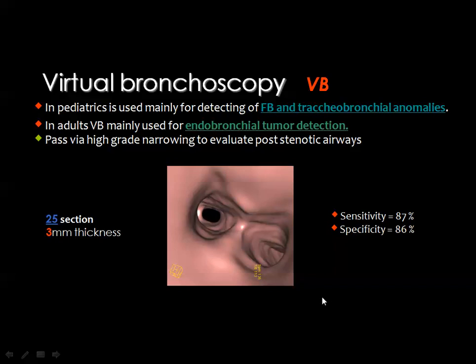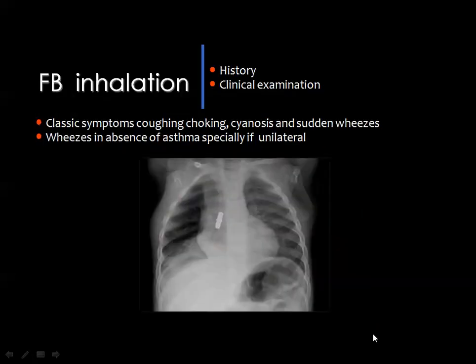And you should remember that virtual endoscope cannot diagnose any of the dynamic lesions like tracheobronchomalacia, for example, but these are static images that can help you to look inside the trachea. And the two major advantages are, in children, to detect an inhaled foreign body which is not detected by the regular endoscope, and in adults, to see the invasion of the bronchi by the bronchogenic carcinoma.